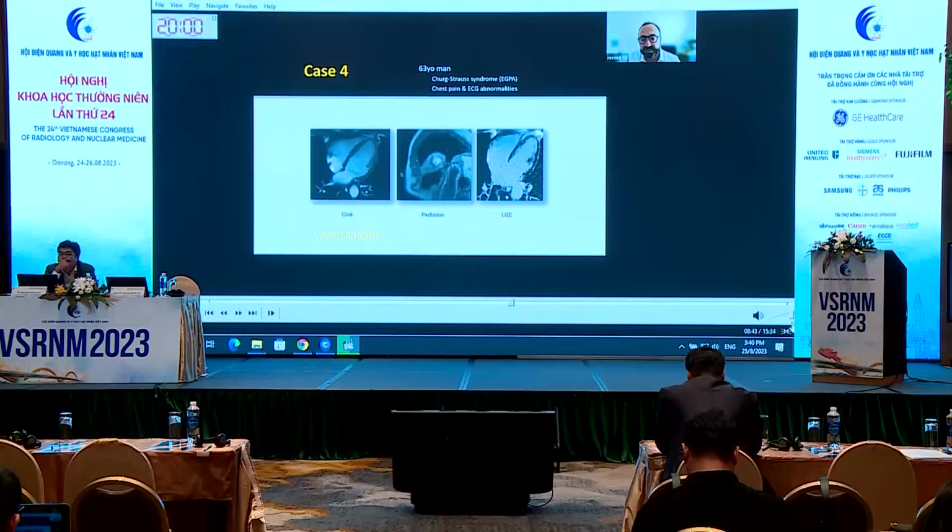Another example with similar findings in this man suffering from Churg-Strauss syndrome. On cine imaging, there is a global hypokinesia of the left ventricle, an apical perfusion defect, and a diffuse patchy endocardial late gadolinium enhancement.